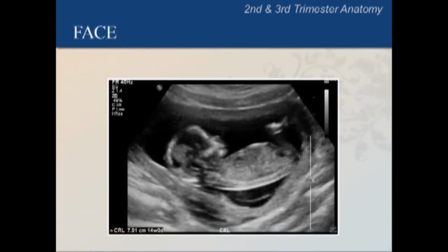This is what the face looks like in profile very early in the second trimester. Which features of the head and body can you clearly identify? Please pause the video now to encourage responses from the group. Here we have labeled the skull, forehead, nose, body, spine, and a leg to make them more obvious.